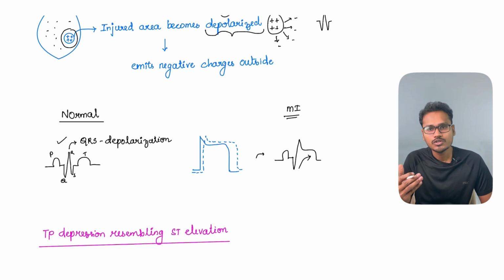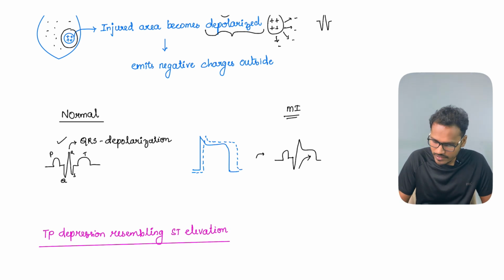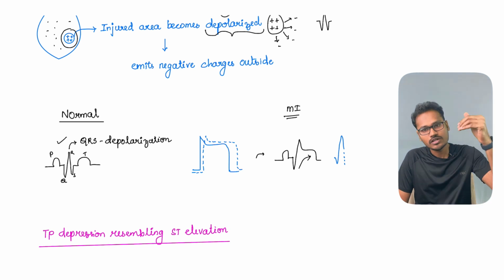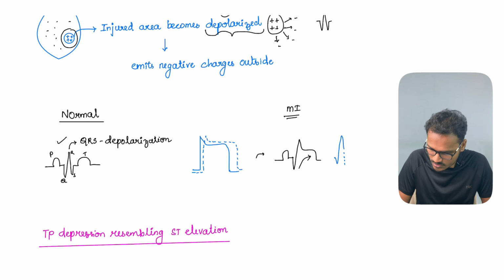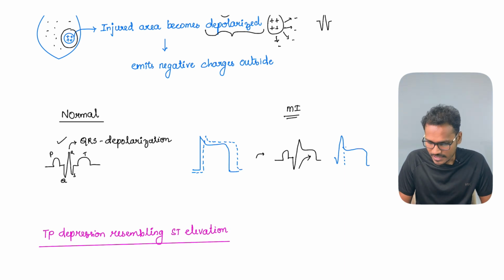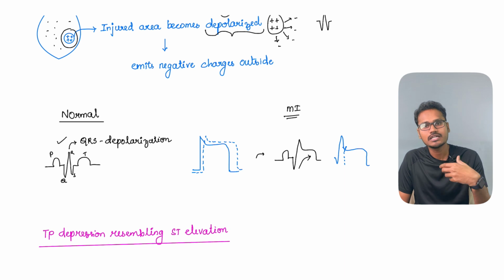So what will happen to the QRS complex? The Q wave is there, but instead of the R wave coming down like this, now more positivity is happening. So it will not keep on coming down. Instead of that, it is going to try to stay relatively more positive, and by that time the T wave also merges with it. So why has this elevation happened? Here ideally it has to come down, but right now we have more positivity. So it is trying to stay at the positive level, and finally the T wave also occurred and merged with it.